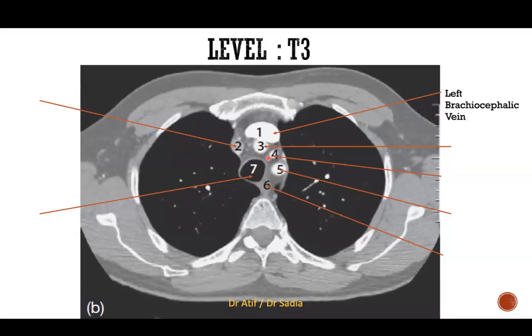The arteries, okay? So this is actually T3, so it's way above the sternal angle. The sternal angle is T4, T5. So we still have to cross T4 and then we can see the sternal angle. There are many reasons we can know for a fact this is above the sternal angle. One is the trachea. It didn't bifurcate, okay? You can see here, it's only one trachea. But some people may get confused and think this is a vein.